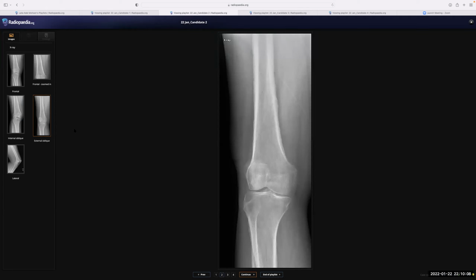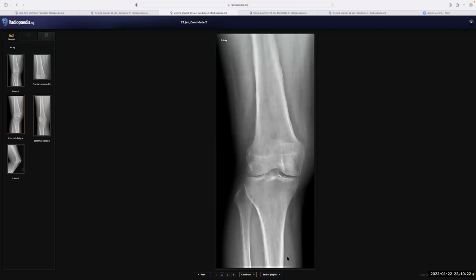Okay. So basically, in this case, you were right about describing the periosteal reaction here, but it's also present in here as well. I cannot see your arrow, Dr. Laila. You can see it here? Yes, now I can see. Okay, so there is periosteal reaction here as well. Yes, and here as well.